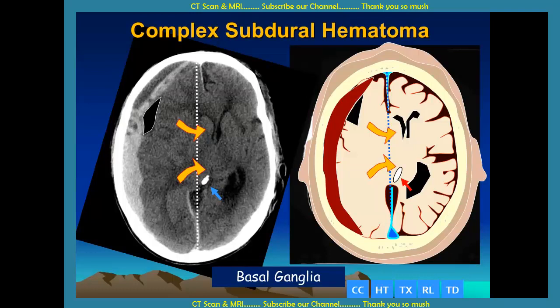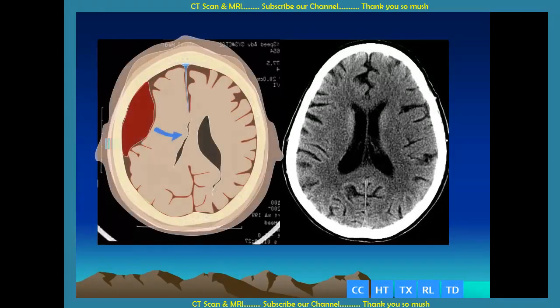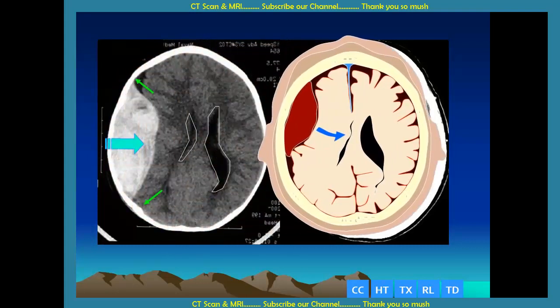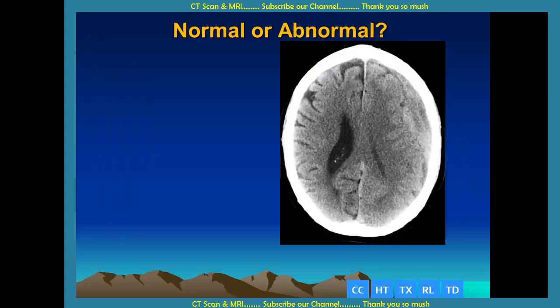Notice that on the abnormal side underlying the extraaxial blood clot, we have compressed the cerebrospinal fluid out of the sulci. Here is another abnormal lesion at the level of the lateral ventricles. Again, we can see a large hyperattenuating extraaxial lesion limited by the coronal and lambdoid sutures, typical for an epidural hematoma. The ventricles are being compressed and displaced by this extraaxial mass lesion. We have a biconvex extraaxial hematoma consistent with an epidural hematoma.